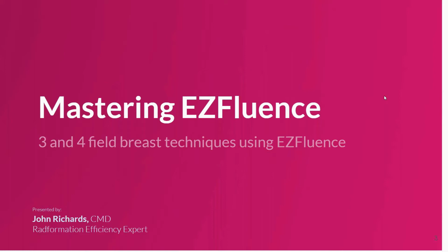The reason that we decided to put this webinar on today is because we receive a lot of questions for training everybody on 3 and 4 field breast plans and the different workflows utilized. So today we're going to be reviewing the different workflows used with EZFluence for creating quality 3 and 4 field breast plans.